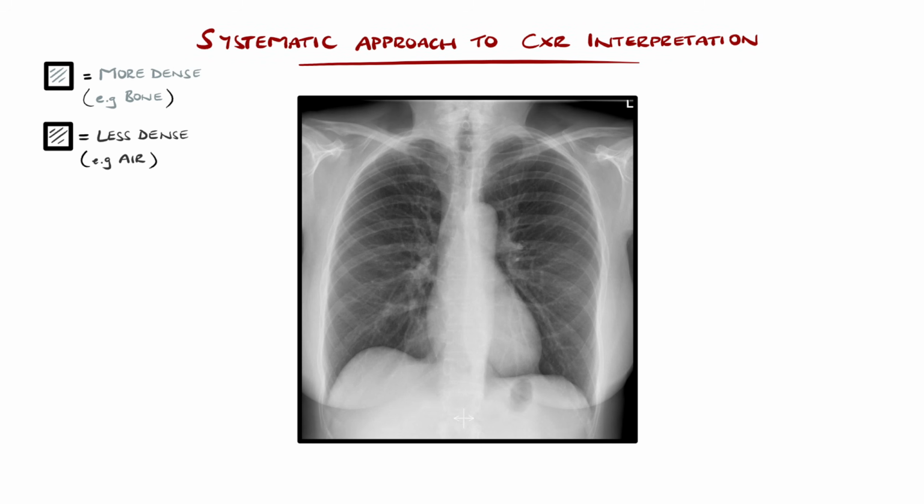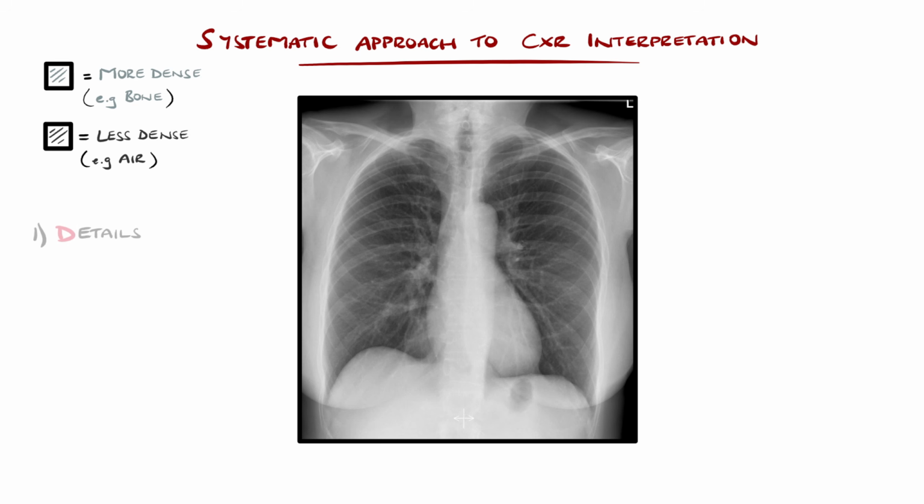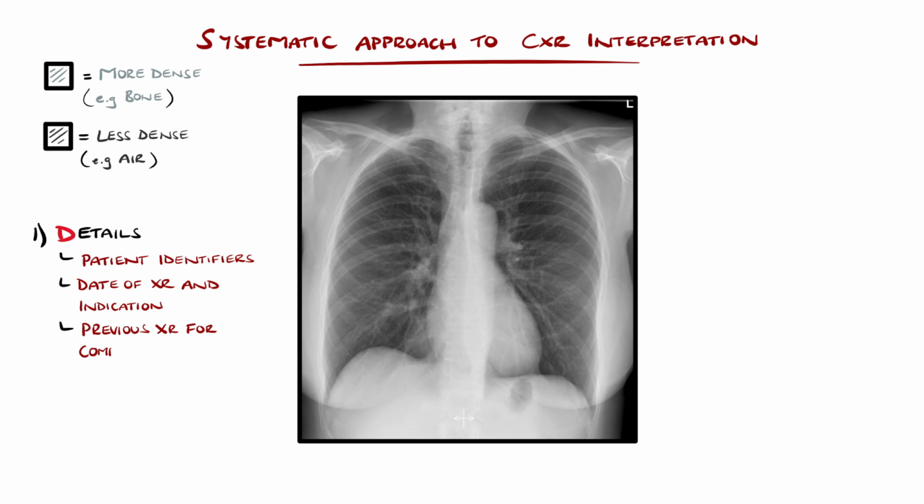A common way to remember a systematic approach is the mnemonic Dr. ABCDEF. The D stands for details, which may sound trivial, but ensuring you have the correct patient is fundamental, and other elements to check here include the date of this x-ray, as well as any previous ones for comparison, as well as the indication for it.